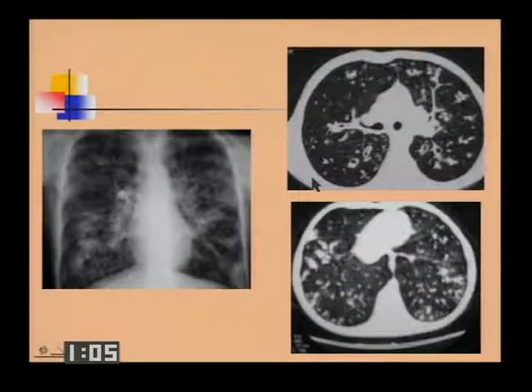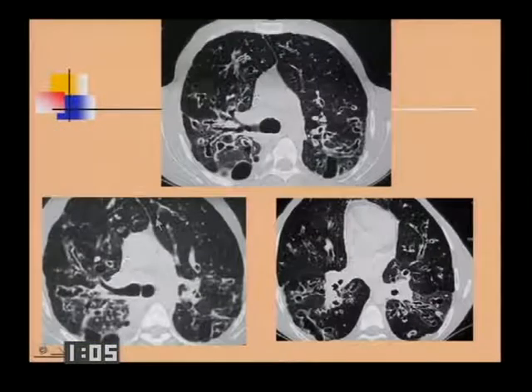You can get mucus impaction, and then you have these little very dense areas. The impaction, if it becomes secondarily infected, can cause bronchiectasis. The bronchiectasis can progress and cause large cystic spaces that become confluent. This is a thickened wall, a bronchiectatic space. This is subpleural.